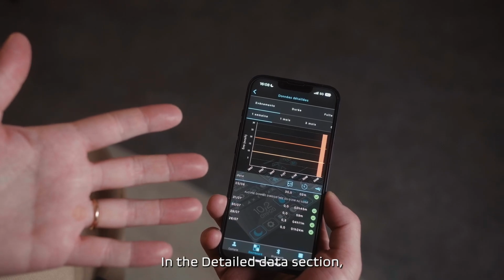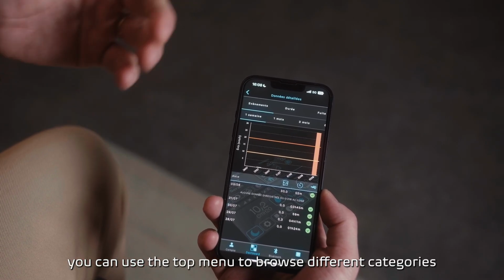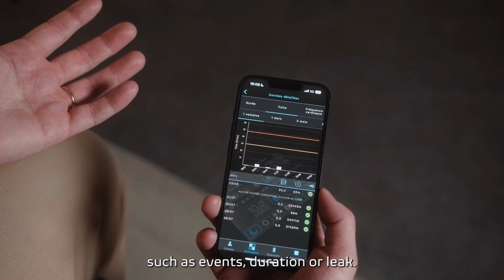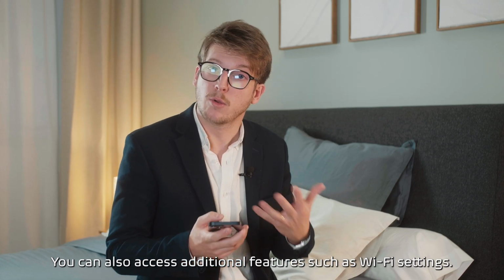In the detailed data section, you can use the top menu to browse different categories such as events, duration, or leak. You can also access additional features such as Wi-Fi settings.